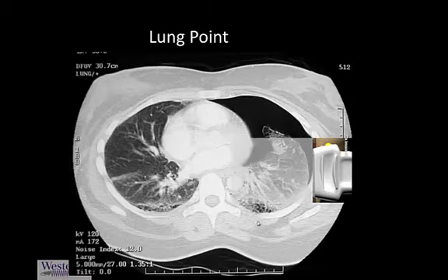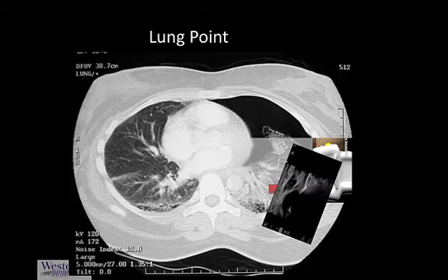So here you have a CT composition of a pneumothorax with the air here and the lung that's up here. So you can imagine that where this red arrow is seen, it represents the intersection of pneumothorax and no pneumothorax. You can imagine what the ultrasound findings would be here, can't we? Because we would have a lung sliding here, an absence of lung sliding here. So if you were to superimpose a crude image here, you would see that we here have a quiet lung, and here we have a sliding lung.